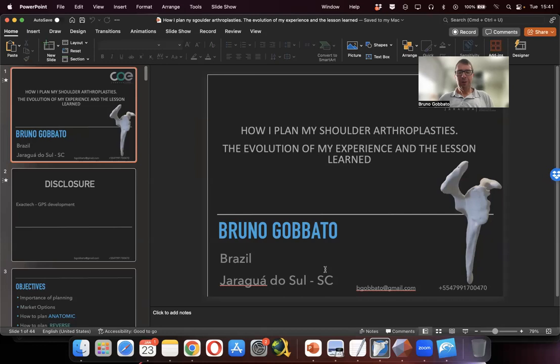Hi, welcome to our lecture about how I plan my shoulder arthroplasties and how we're going to do it live in a very practical way. So in this video, we are going to show how I do my 3D planning for shoulder arthroplasties.